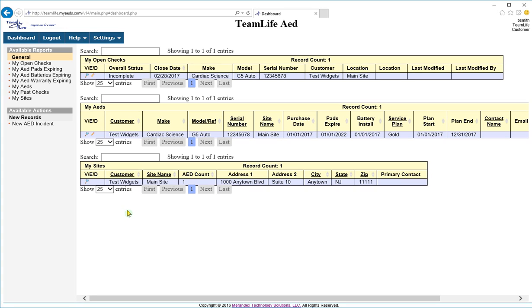In this video, we're going to show you a user of the MyAEDs.com system and the reports and actions that they have available to them. This is a regular user. This is not a customer admin user.